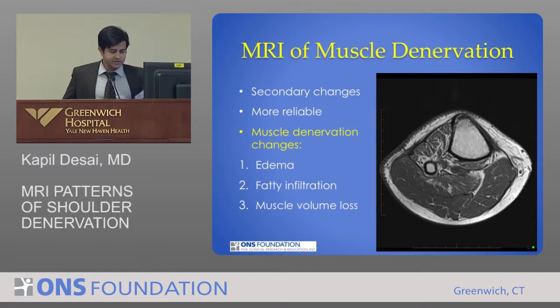This patient went on, didn't get treatment. The muscle went on to, if you compare it to the posterior muscles, losing bulk, getting more fat. These are approaching irreversible changes.